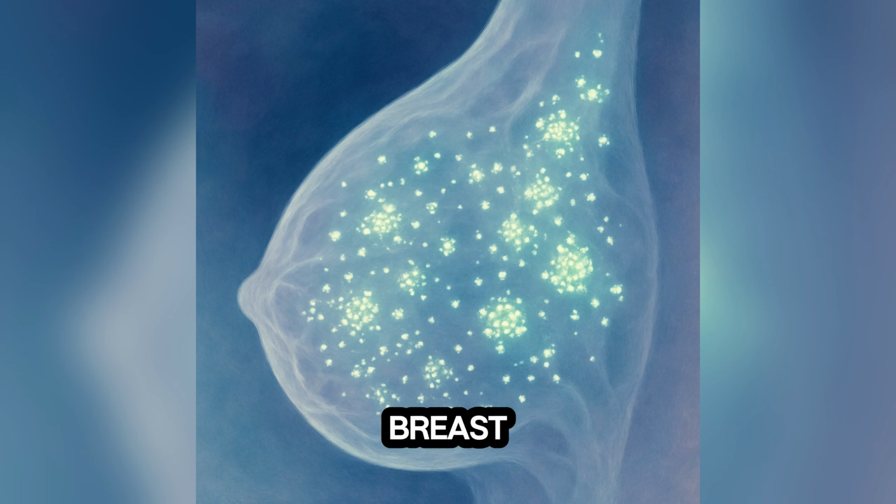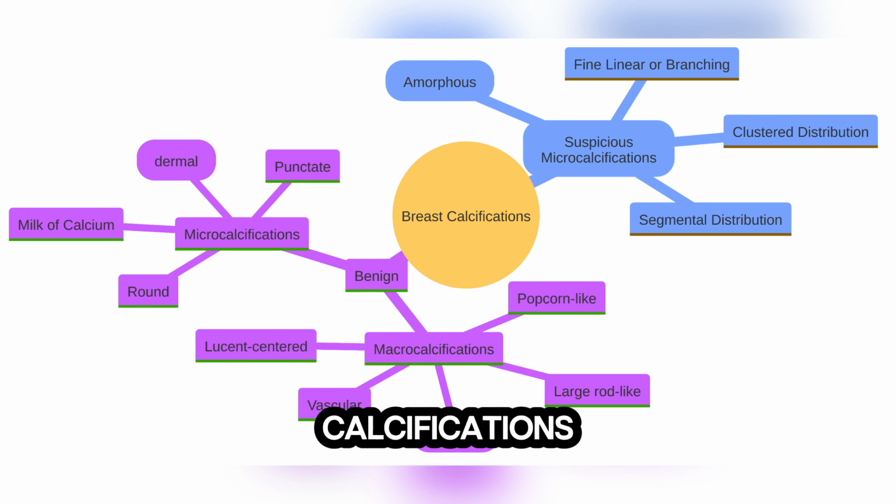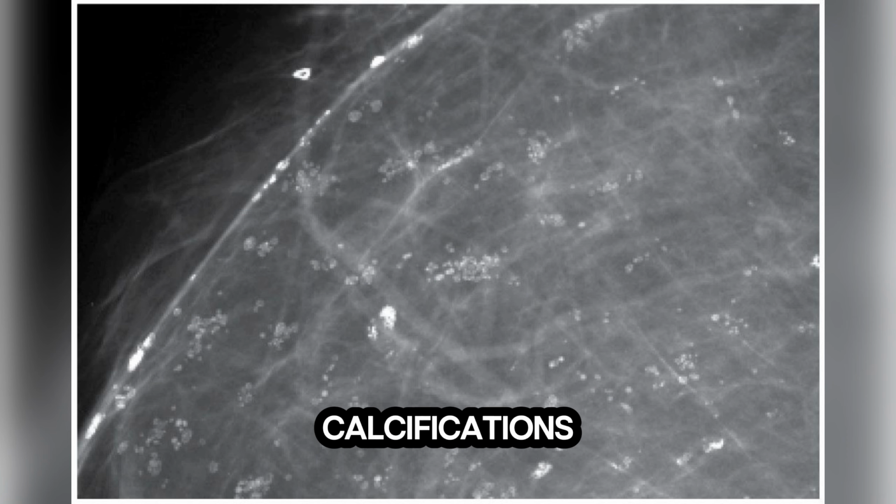Calcifications developing in the breast and detected on screening mammograms are variable in number and appearance, and most reflect a benign etiology. Here are examples of breast calcifications with illustrative images showing benign and malignant calcifications. First, the skin calcifications. As we can see here, multiple groups of round and oval lucent-centered calcifications. This is considered BIRADS 2 and considered a benign finding.